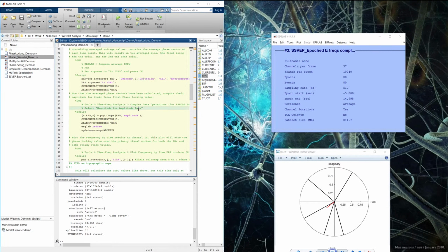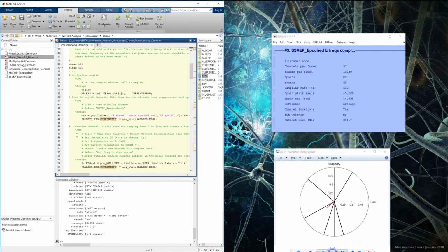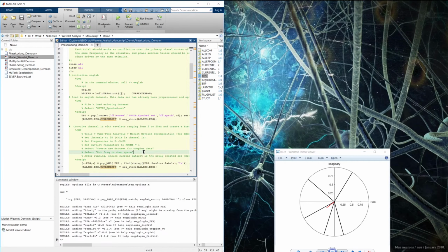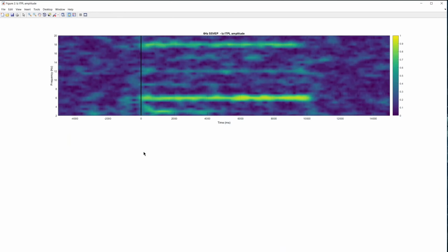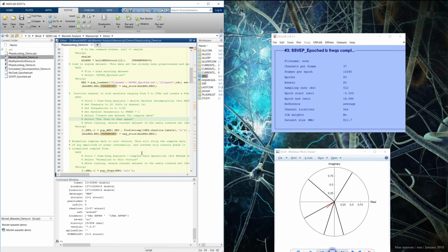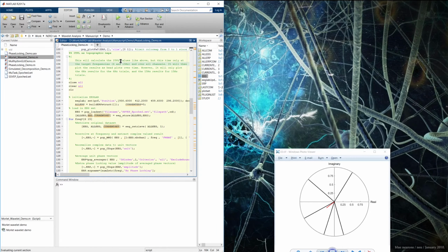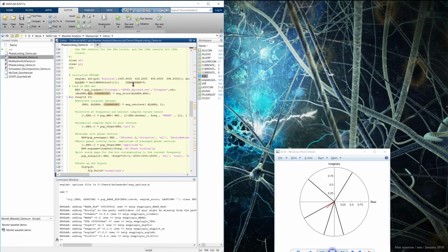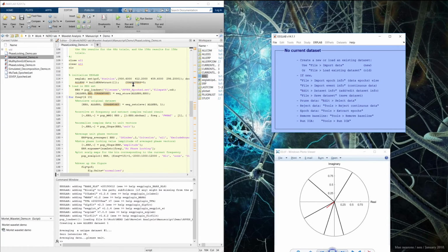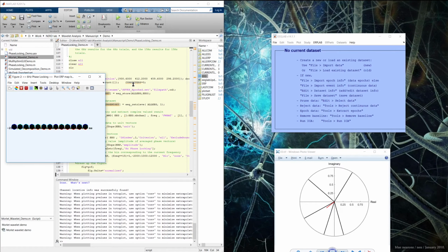Of course, just like in the last demo, I've included a script that will duplicate what we just did here, along with step-by-step GUI instructions. And here, if I run this, you see the exact plot that we looked at just a moment ago. Also down here, there's another section of the script that, rather than calculating the phase locking at only channel IZ across so many frequencies, is calculated at just 6 and 15 Hz across all channels, and will plot the time domain head plots using ERPLAB's Scalp map plotting functions.